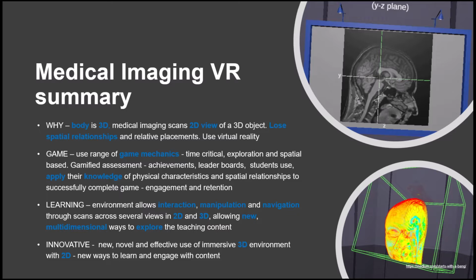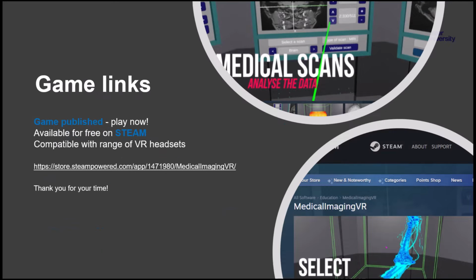The learning environments created allow the interaction, manipulation, and navigation through scans across several views in 2 dimensions and 3 dimensions, allowing new multi-dimensional ways to explore the teaching content. The project is an innovative way to use immersive 3D environments with 2D content to engage students and players.